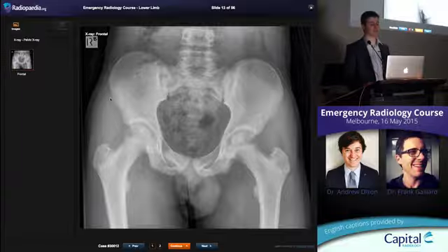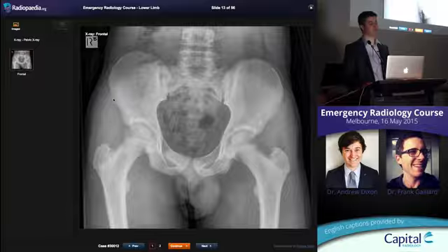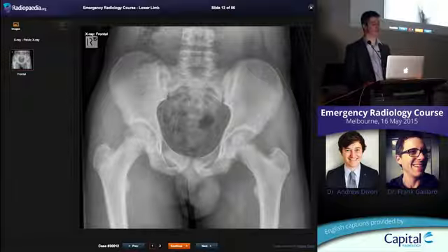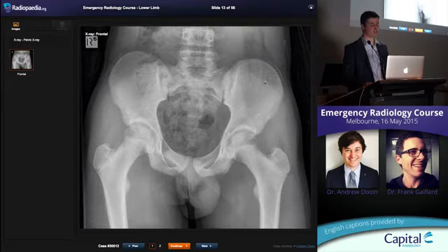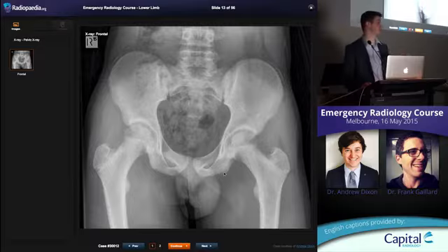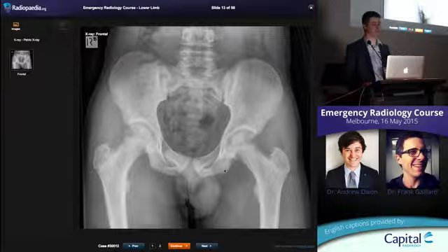You've got the anterior superior iliac spine here where tensor fascia lata and sartorius are going to have their origin. You've also got the abdominal muscles coming off the iliac crests up here. So plenty of places. And of course, the hamstring origin coming off the ischial tuberosity. You've got lots of places where kids can pull off little bits of bone from those apophyses. The tendons in kids are stronger than the cartilage sitting at the apophysis, so they're going to pull them off.